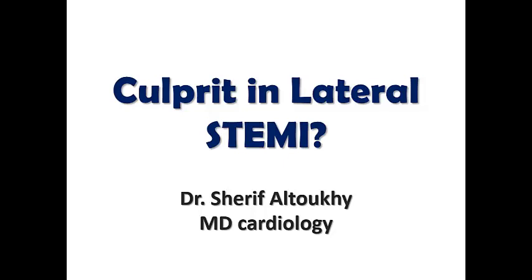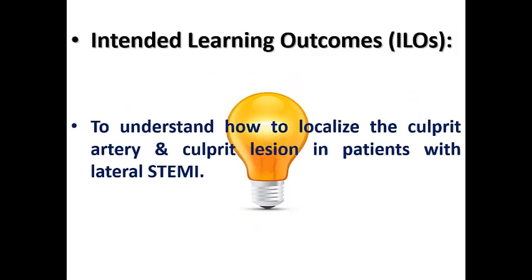Hello everyone and welcome to the second lecture in the interesting topic of culprit vessel and lesion in STEMI. Today we are speaking about the culprit in lateral STEMI. Today we are going to understand how to localize the culprit artery and culprit lesion in patients with lateral STEMI.